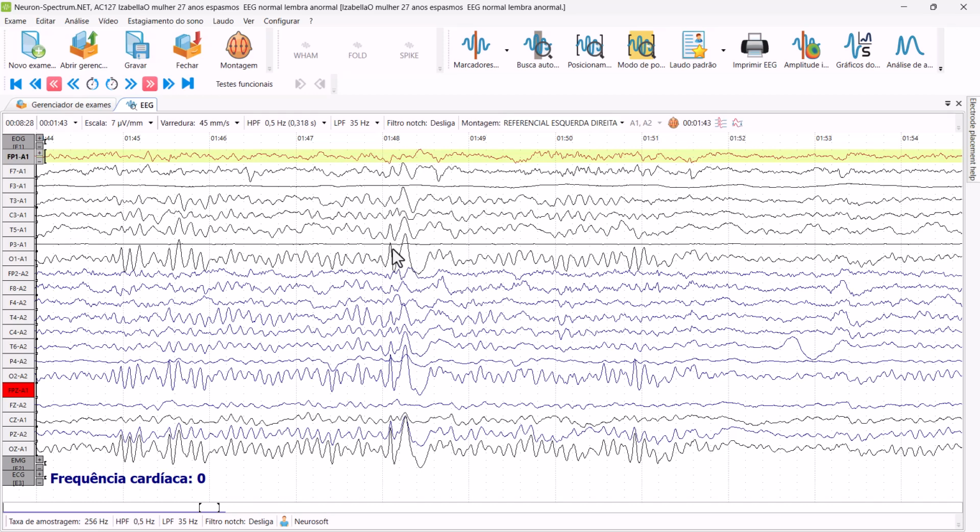This worries us. But note that if this wave over here is a spike wave, if this over here is an epileptic spike, so this spike over here is also an epileptic spike, and this one also an epileptic spike, and this one also.